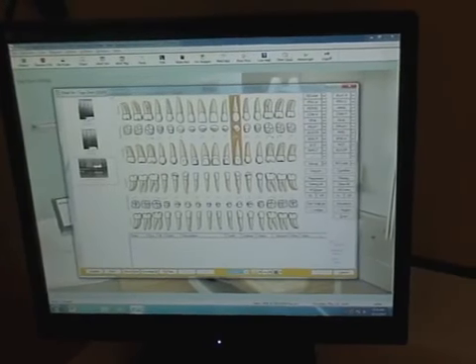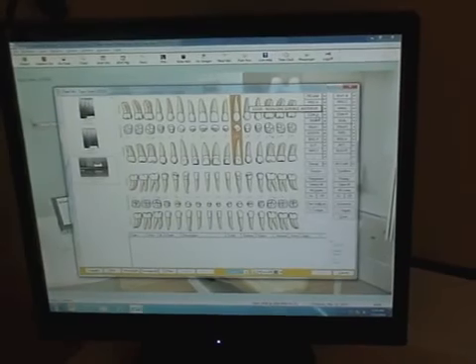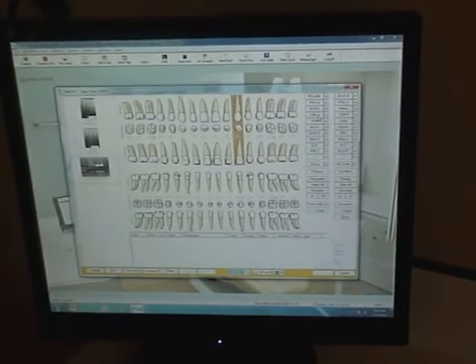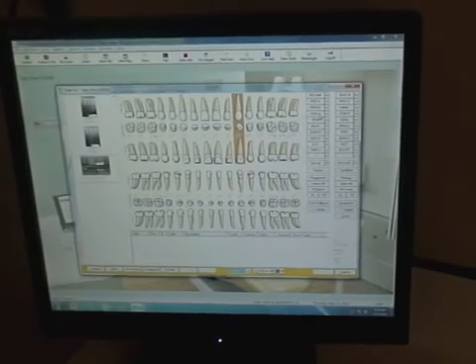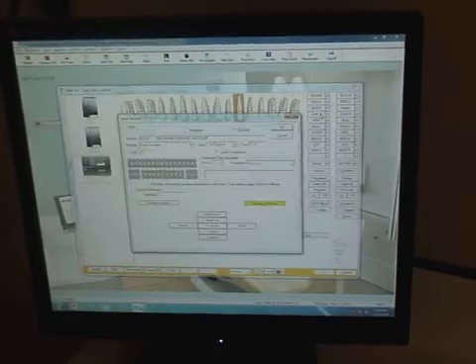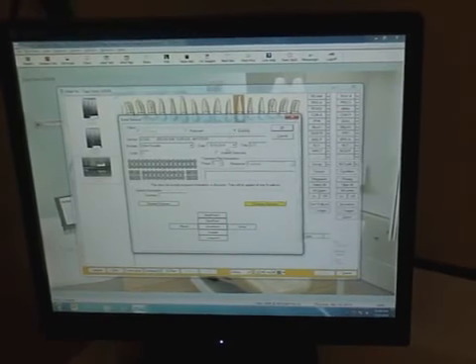After selecting the tooth, we can move on to the COM-A button. COM-A stands for a resin composite in the anterior portion of the mouth. Click the COM-A button. It will show that the restoration is already existing.